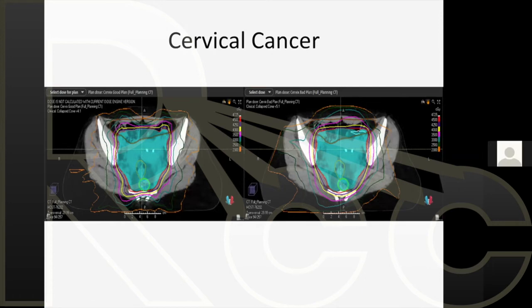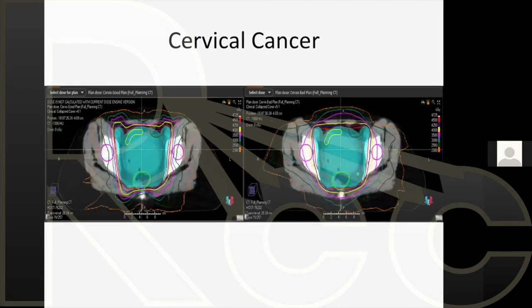But I think it has to do with, you have to look and see, what do we want to worry about and what is important to us? As we go further down, again, this is now treating more soft tissue anteriorly. So what's going to happen? Anteriorly, then the patient's going to have skin reaction. Down here, this is actually treating more of the sacrum. What is going to happen? The patient will have a skin breakdown, right?